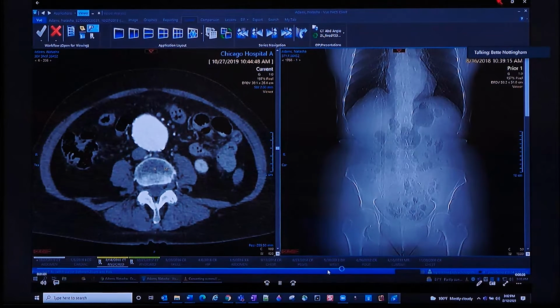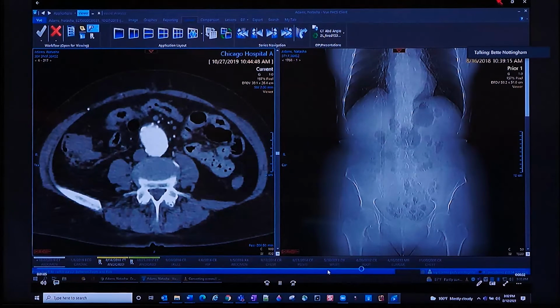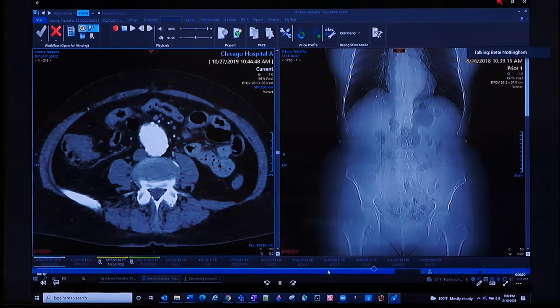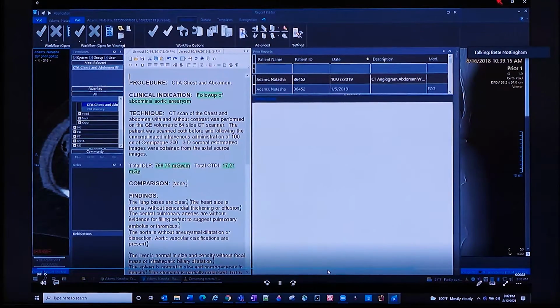The context information helps on the report as the X-ray indicates a peptic ulcer, a potential cause of the perforation. Also, it is clinically known that a perforated ulcer can result in peritonitis. So this is key info to Natasha's record.